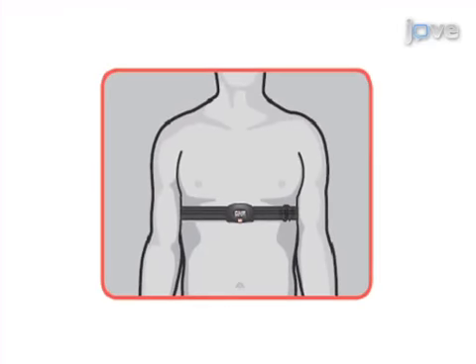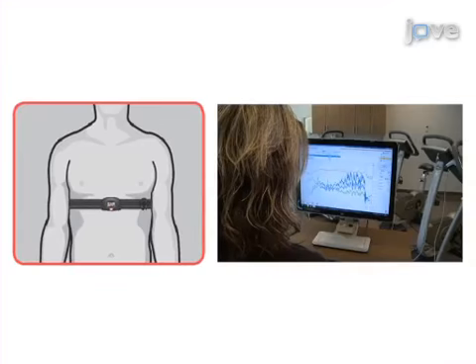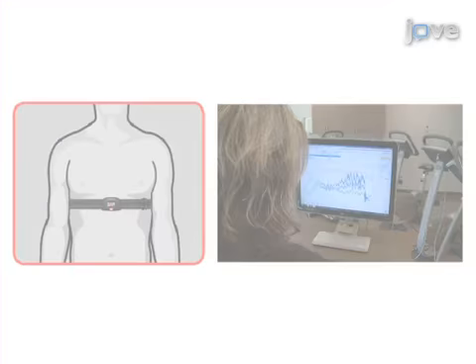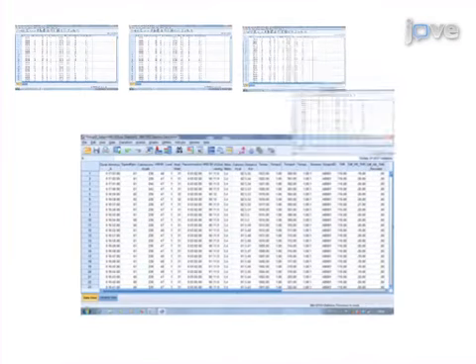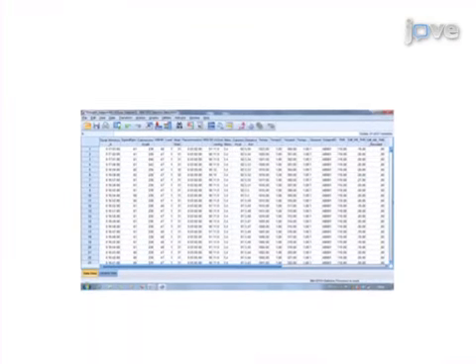Using data tracking software, a single file of raw data is obtained for each subject for each training session and then converted into an Excel format. Next, statistical software is used to extract and combine data for a single file per subject, which allows for the achieved intensity to be compared to the target intensity.